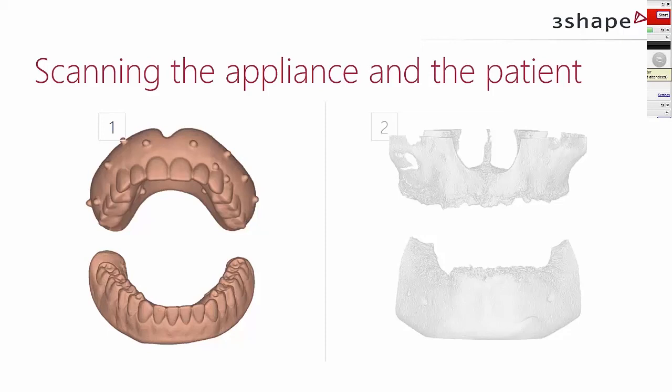Some CT scanners come with these stands or holes for this workflow specifically, and some don't. For the ones that don't, we hear a lot of good feedback about using a styrofoam block to raise your denture into the center of the field of view and then place it on this styrofoam block. It's a material that has a significantly different density than the denture, so it will not influence the actual scan of the denture if we capture any of the styrofoam.